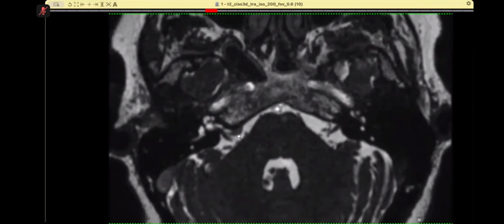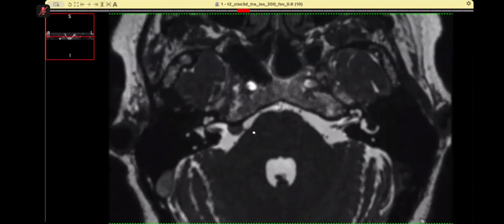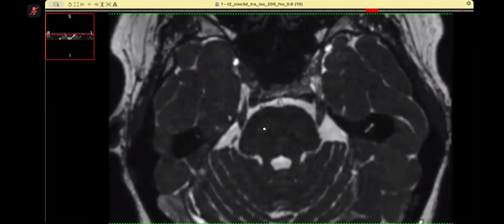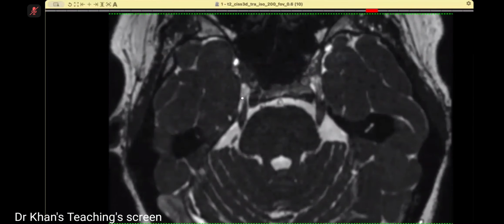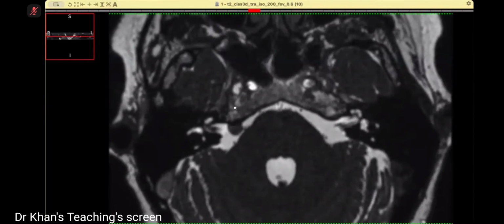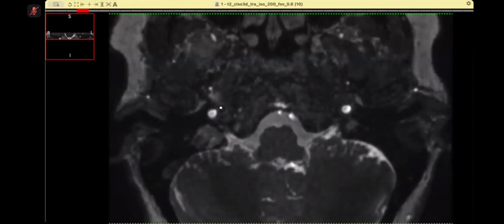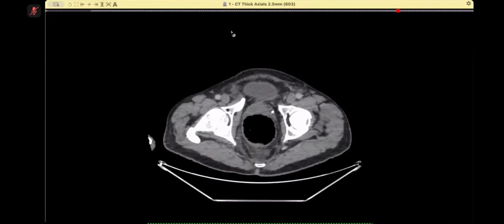It is maybe displacing it. So this is that meningioma which was causing everything. And anteriorly, another Viva scenario here is that they will ask you the anatomy of the trigeminal nerve. So this is the trigeminal nerve, which is going into the Meckel's cave, and this is the Meckel's cave. So this case also is an anatomy type of a case. Well done, candidate 3, did very well.